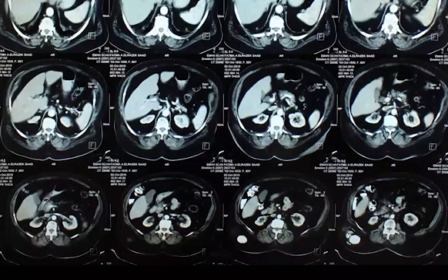Right. The right. The plain film has got its fallacies, but the CT will not have got its fallacies. طب يلا شفتيها؟ شفتي حته الباول دي اللي طالعه لبره؟ Looking on the left side, anterior posterior. لا ده anterior. انا بدور على posterior. طب وحاجه لونها ايه؟ hyperdense او hypodense. طب يلا يا هوا يا صبغه. اهي ده hyperdense اهي. بالظبط كده. شفتيها اهي. يبقى what type of hernia is this again؟ Lumbar.